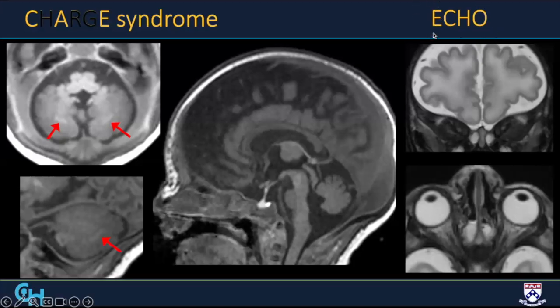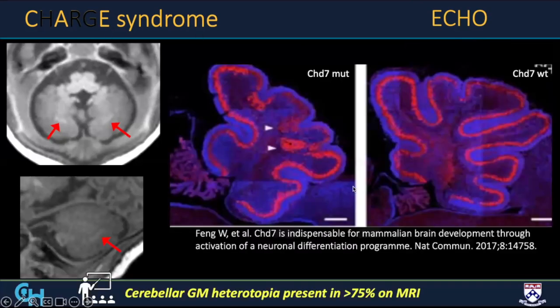So these are the ear abnormalities, so semicircular canal hypoplasia, cochlea hypoplasia, and then you can see clival clefts in over 90%, hypoplasia of brain structures, and hypoplasia of the olfactory apparatus. So these are really strong features of CHARGE syndrome, and you should also look for those in addition to what we conventionally think about for CHARGE syndrome.